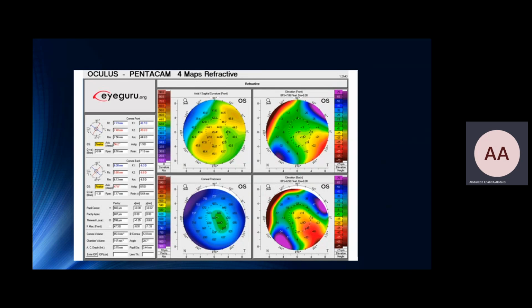And then I'll move to the elevation map and see the elevation map in the middle, that's +3. And see the 5 millimeter zone, compare and see the difference among them, and see the number R2.